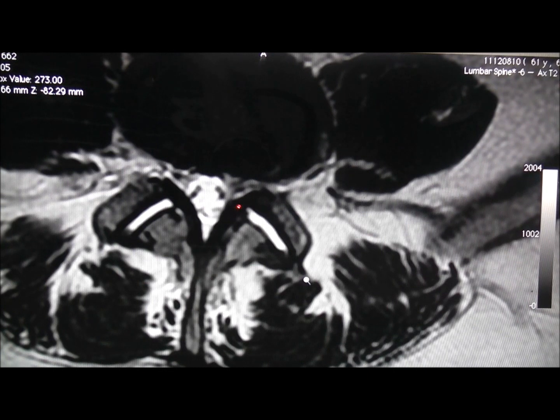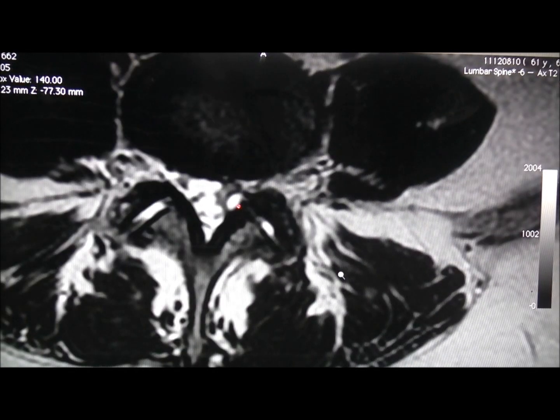This was a lady, by the way, who'd been to see various practitioners, therapists. She'd had multiple sessions of what she said was lots of ultrasound of her lower back, and she wasn't really making good gains. So we had an MRI done, and as you can see from this view, just at the edge of this facet joint, there's this little white bubble exiting the facet. It's basically a synovial cyst, which is encroaching within the lateral recess or posterior aspect of the canal.